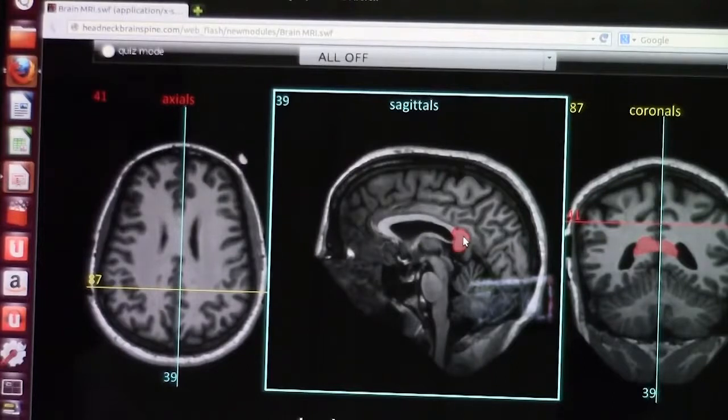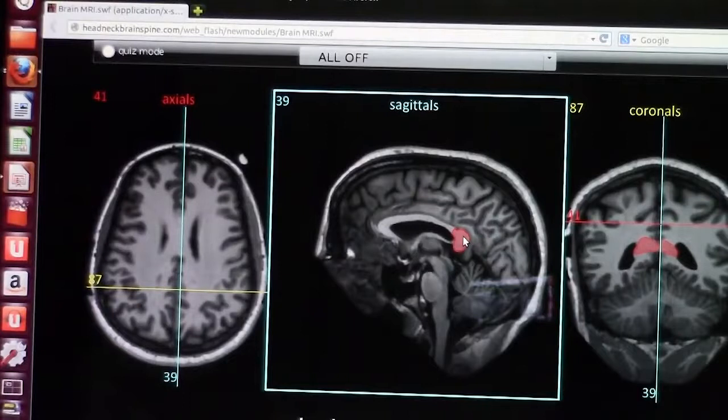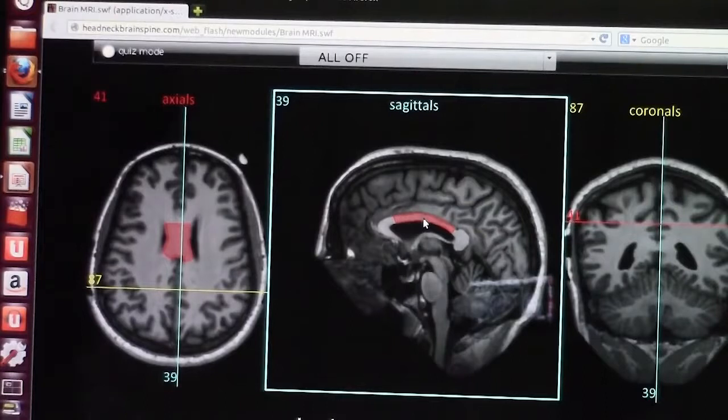which indicates bilateral hemispheric dysfunction, as in the case of brain atrophy. It is also very important to look at it in the adult, especially in demyelinating lesions, as in the case of multiple sclerosis, and also sometimes you can see certain tumors like butterfly glioblastoma multiforme that can cross the midline through the corpus callosum.